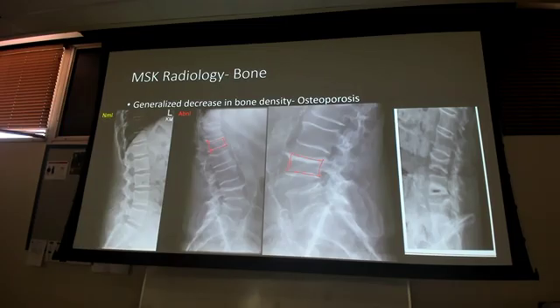A couple other things going on in this x-ray, right? So, we got that right there. That's a calcified aorta. Seen commonly in older patients, her aorta is starting to calcify. That's why we can see that. We normally can't see the aorta on an x-ray, but if it's calcified, it may stand out. So that's what that is right here, a calcified aorta. All right, and then another one right here, another calcified aorta. That's what that is on that x-ray.